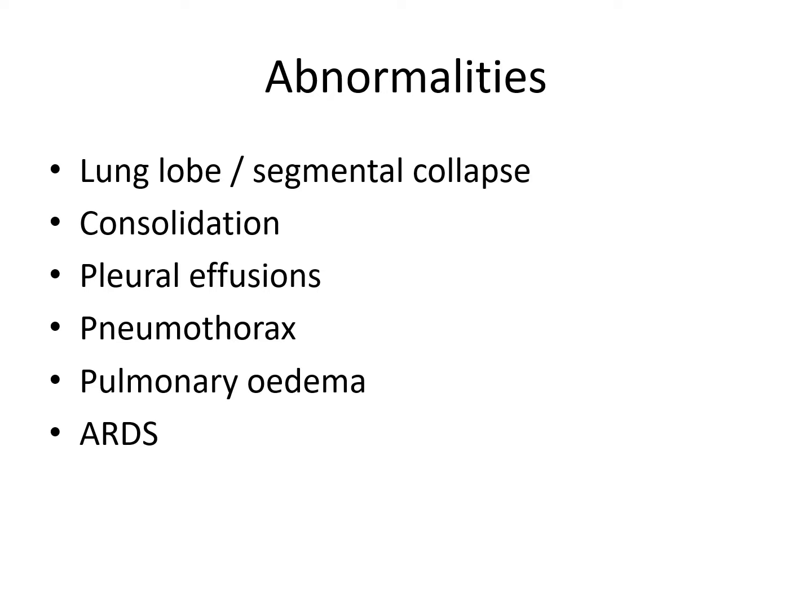Pleural effusion is a loss of the costophrenic angle, which is usually replaced by a meniscus type line. There's general opacity over the base of the affected lung or the area where you think the effusion is. The line is normally concave, which marks the upper extent of the effusion. And in sitting you can normally note the effusion line or the fluid level.